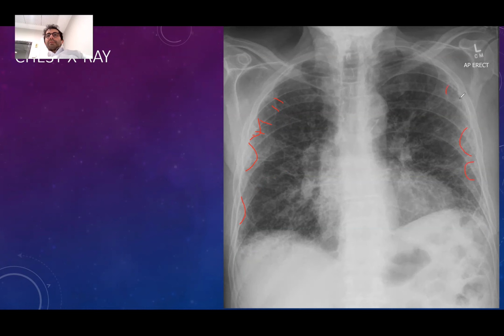The lung is old in this patient. It's very coarse, so it can be an interstitial lung disease as well. I'm leaning towards interstitial lung disease because it's very coarse. This is probably fibrotic changes, but heart failure should always be in our differential diagnosis. Thank you, doctor. That's pretty much it.